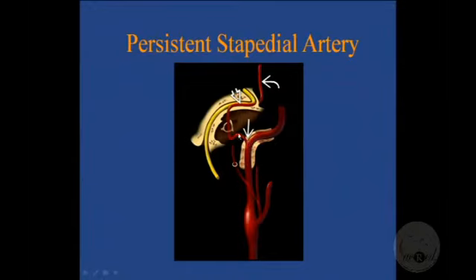And the stapedial artery goes through the middle ear in a caudocranial direction. Goes from the bottom to the top of the middle ear. And when it goes through it, it actually goes through the obturator foramen, as someone answered. Then it hits the tegmen tympani, or the roof of the middle ear, and then enters. That's the facial nerve. That's the geniculate ganglion. That's the labyrinthine segment and the tympanic segment of the facial nerve. So the stapedial artery enters the roof and then runs along the facial nerve for a short course. Actually, it is not the entire course.